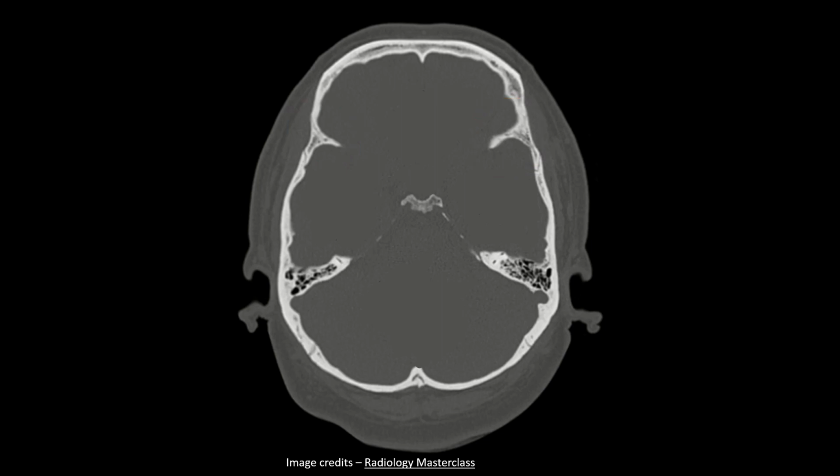Let me direct your attention now to these two faults in the bone. And to refresh your knowledge, notice that the cortex does indeed extend into these faults, and they are not straight but have a jagged pattern to them, and they are thus sutures, and in this particular case they happen to be the coronal suture.